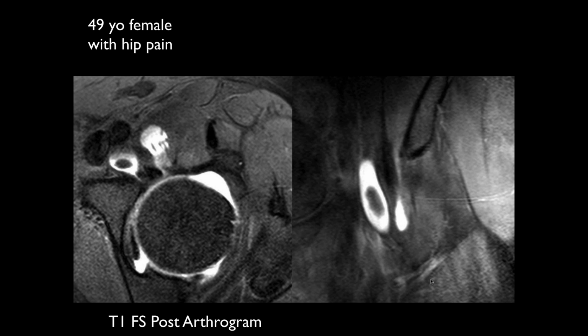Right. Dan, what do you think of this case? It looks like we got a 49-year-old female with hip pain. We got an axial, and maybe a coronal, T1 fat sat arthrogram of the left hip. Where we see anterior to the labrum or acetabulum, there is this low signal lesion, which maybe is a cyst. I'm saying it's like a loose body within a paralabral cyst, or it's kind of deep to the vascular structures. It looks like a loose body.